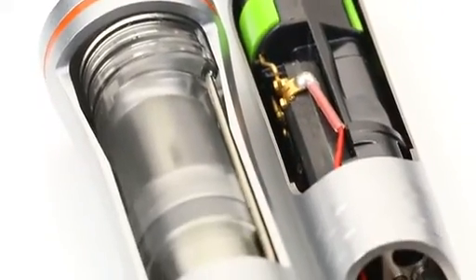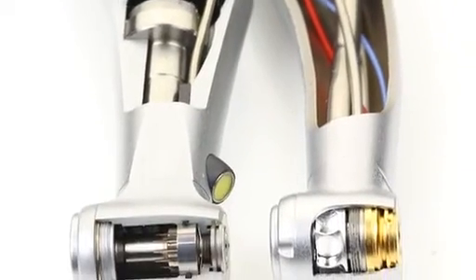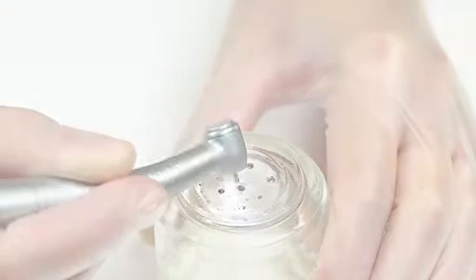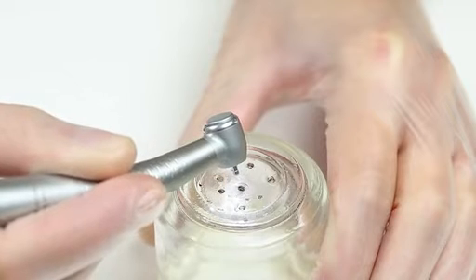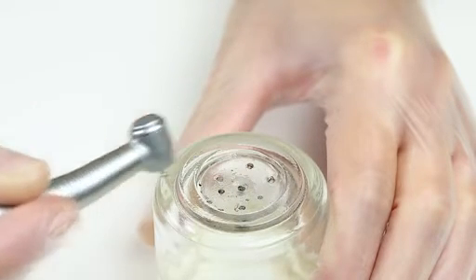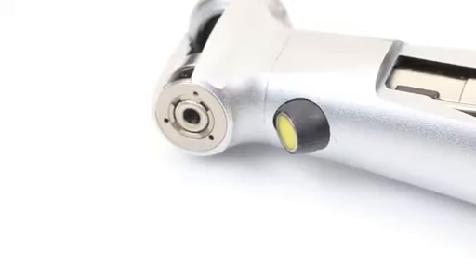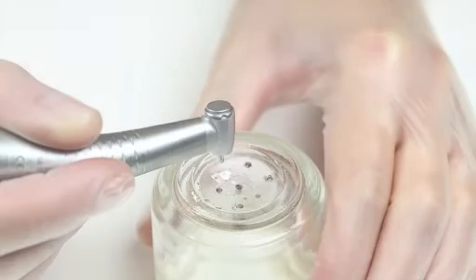Air-driven dental turbines are more lightweight than red contra-angle handpieces, need no additional motor or control, and require less investment. As these turbine handpieces are only driven by a small rotor, their power is limited and seriously dependent on the contact pressure. Setting the speed is generally not possible, and the high-frequency operating noise is unpleasant for many users and patients. In comparison, high-speed contra-angle handpieces can be adjusted within a speed range of approximately 10,000 to 200,000 rpm.